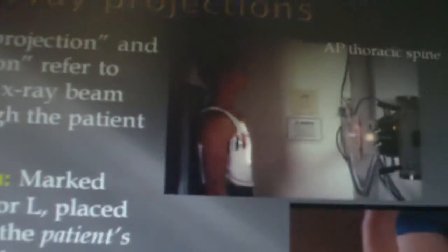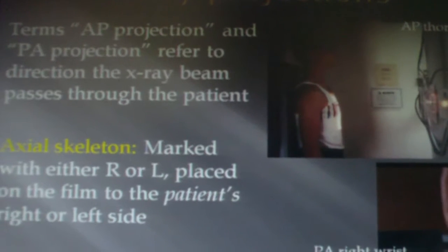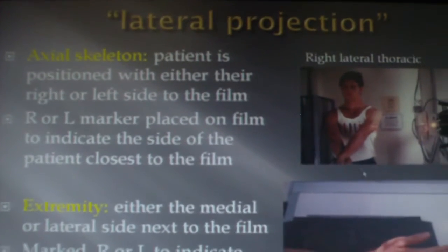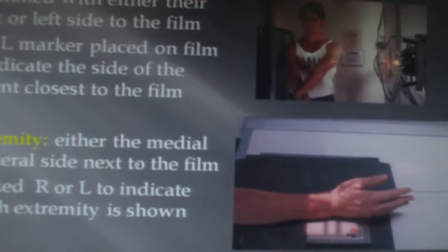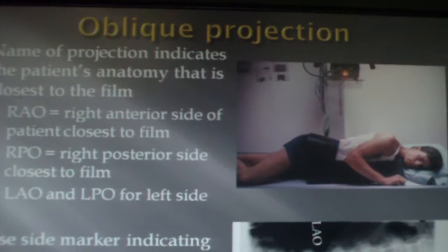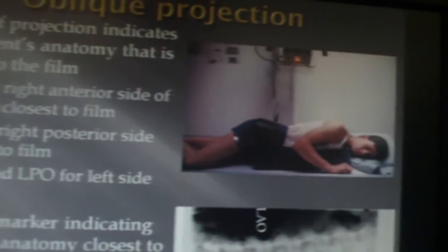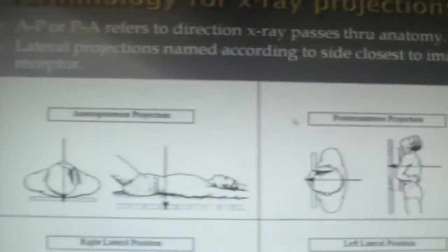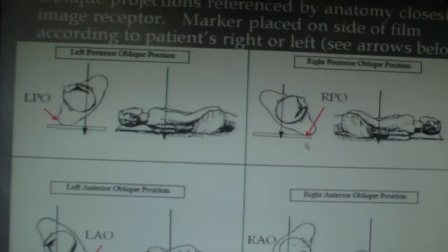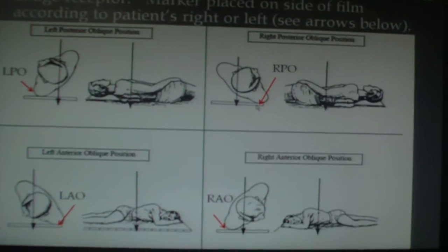Kind of know the projections a little bit, I could ask you, is this an AP, a lateral, or an oblique? You should be able to put that together in looking at the spine. Maybe more important when we get into a particular skeleton to talk about those things. Again, know your obliques. So these are lumbars, right? Not cervicals. So maybe, well, wait till I get there. Coming up. So realize that the posterior aspect of the patient relative to the bucky defines this as a posterior oblique.